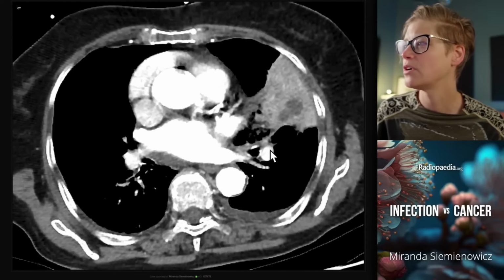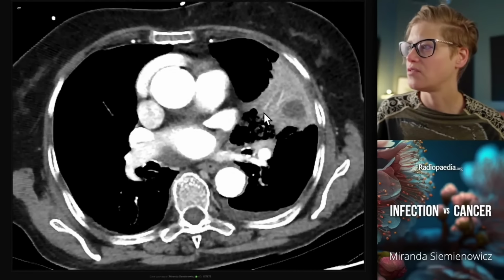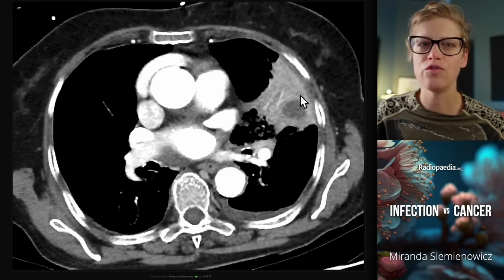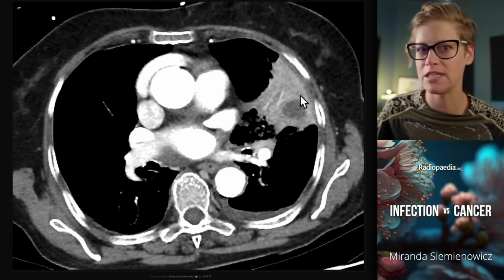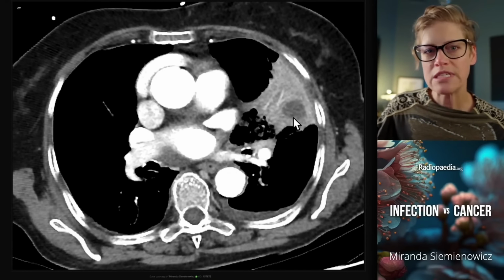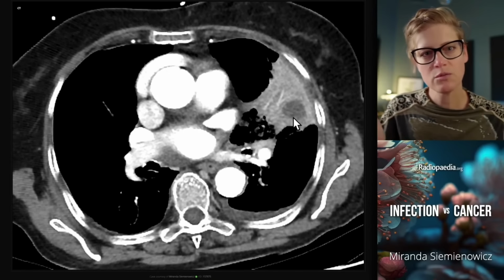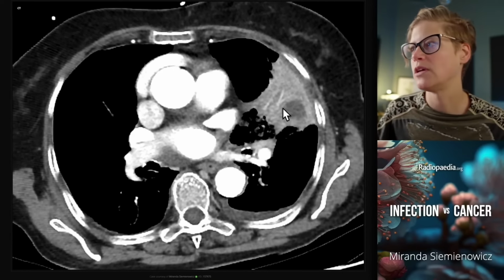And once we put this up, what we can see is that the enhancing component of this lesion has a very uniform density throughout. And what is most important here is that it's got internal vascularity, but not just some or a few vessels. It's got a sufficient number of vessels that would be explained by the volume of lung that you expect to see here. So if you imagine this was aerated lung, what we want to see here is actually just a few more vessels, because consolidation creates volume loss, which means vascular crowding, which means you want to see even more than you would see if this was normal aerated lung.